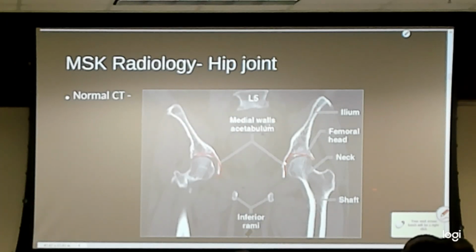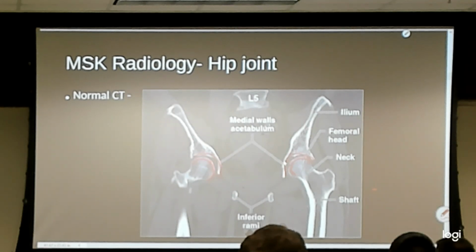So the acetabulae, both femoral heads. On this side, you can start to see where the fovea is going to be by that extra thick bone. We don't have a great view of either trochanter on this side. A little better here with the greater trochanter.